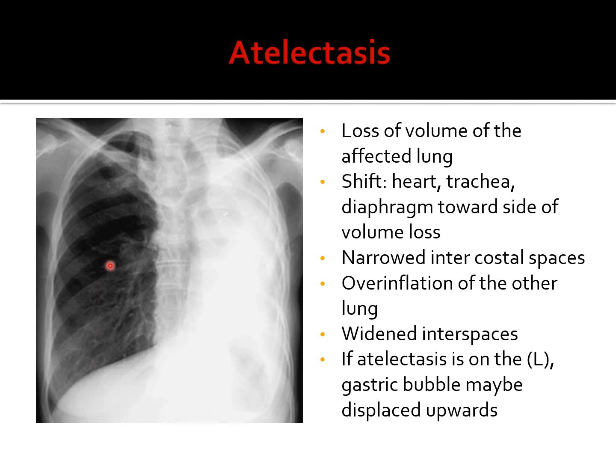interspaces. If atelectasis is on the left, the gastric air bubble, as you can see it here, is displaced upward because the hemidiaphragm also moves upward secondary to the atelectasis on the left side.